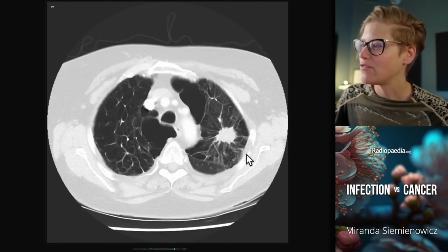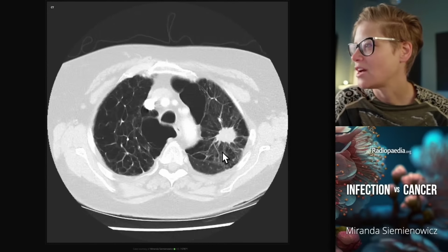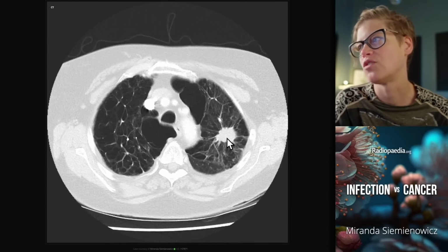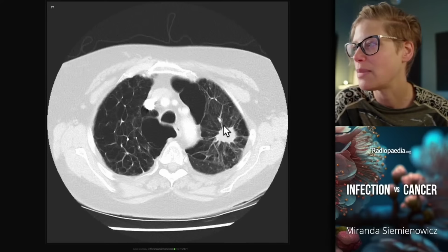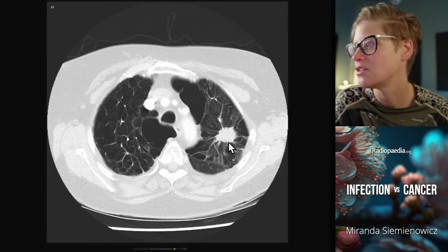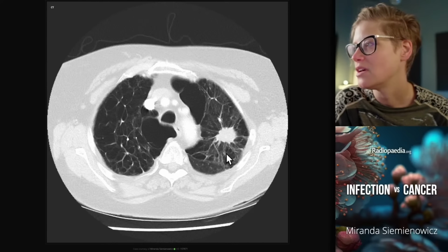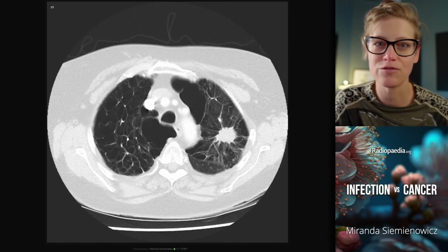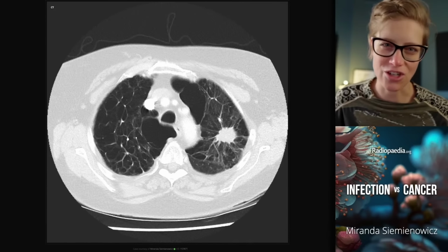Let's go back to the blackberry from the beginning of the talk, just because this beautiful microlobulated lesion has a fantastic demonstration of the corona radiata, and we'll just admire for one moment these fine and very densely spaced reticulations that are emanating from the lesion. They are closely spaced. They are in excess of the allowed linear markings that would be expected in this region of normal background lung, because the lesion is in charge.